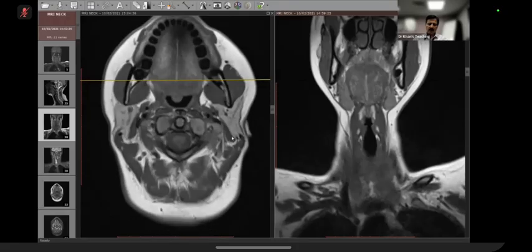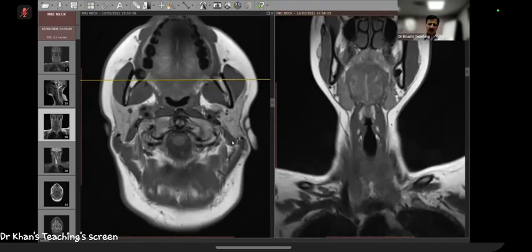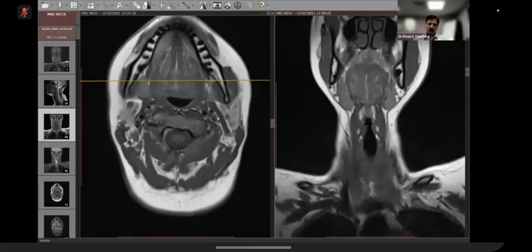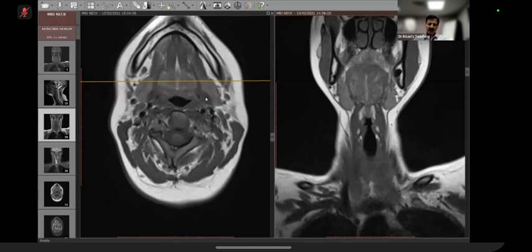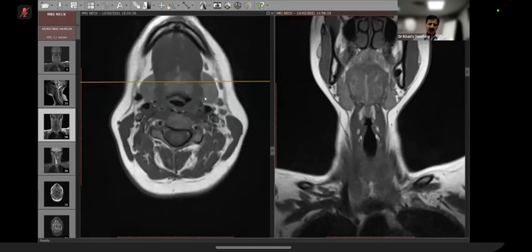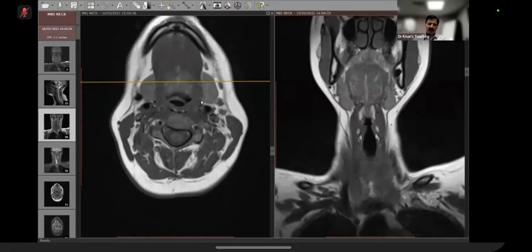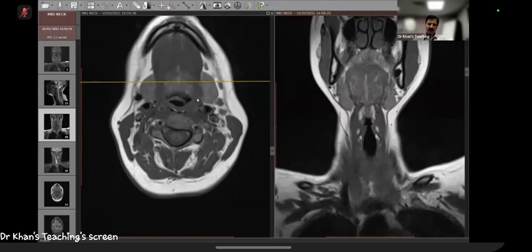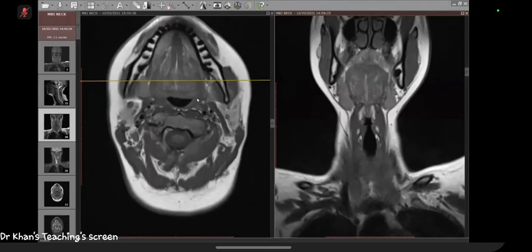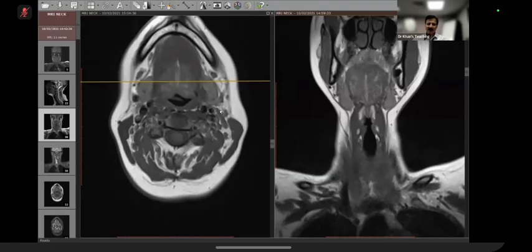Now there is a muscle which apparently is arising from the mastoid process. If you see here, and it goes like this, and it is still going where I am pointing out. Actually, if you stretch your imagination, here is the hyoid bone. So it goes here and attaches with the hyoid. So over to you. Please name the muscle. Stylohyoid. Posterior belly of the digastric.